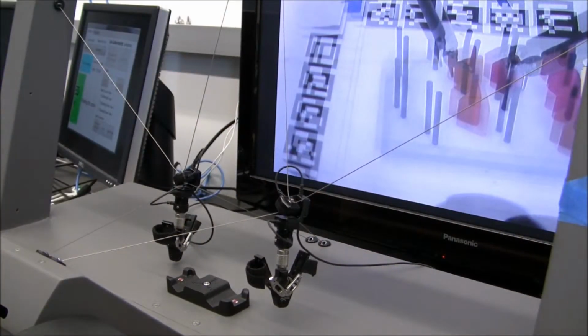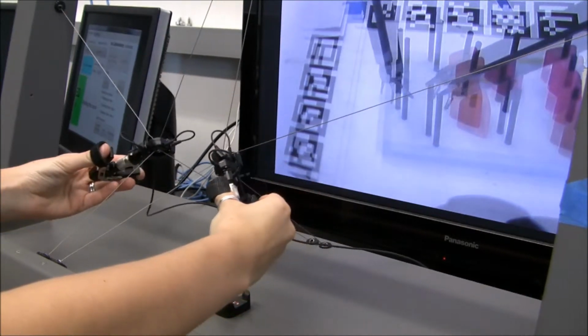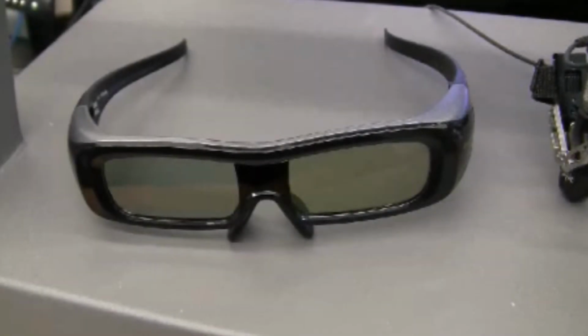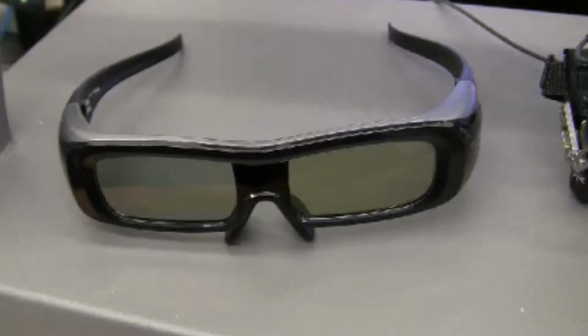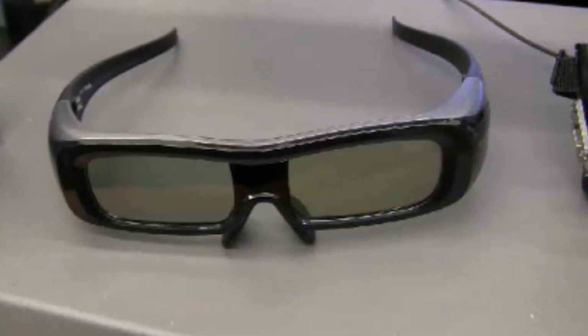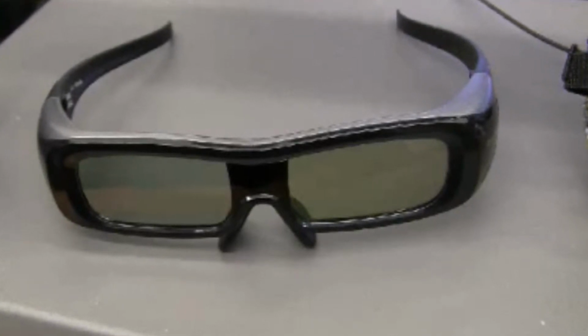Anytime we refer to the surgical site or slave console, we are referring to the location of the robotic arms and instruments. The surgical console is set up such that you can view the movements of the robotic instruments on a 3D screen behind the master controllers. You will therefore need to wear 3D glasses while working on the Raven. So keep in mind that if you normally wear glasses but you also own contact lenses, you may want to wear your contacts for your sessions with the Raven to avoid having to wear 3D glasses over your regular glasses.